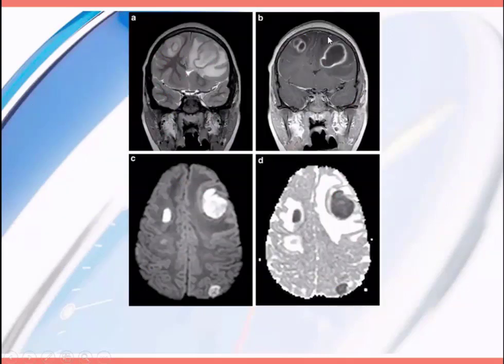For example, we have here multiple cerebral abscesses. In T2, it has a peripheral rim, hypointense rim, and internal hyperintense contents and surrounding vasogenic edema. After contrast, you can see that there is a uniform linear enhancement of the periphery, and the contents also are non-enhancing. Then we have the true diffusion restriction of the contents. So the true diffusion restriction of the contents is pathognomonic for abscess.